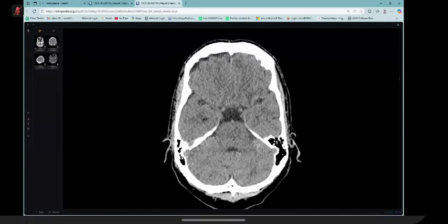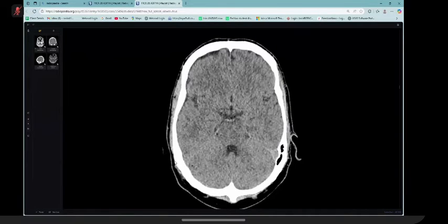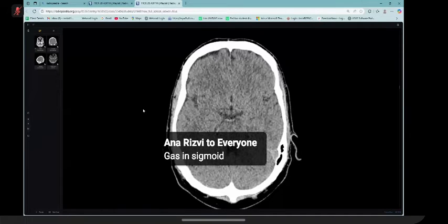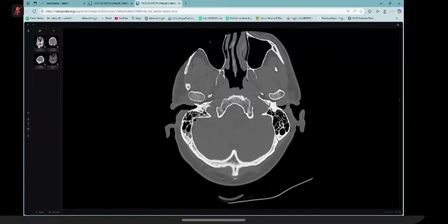It could be due to sinus thrombosis post-trauma. There's a small air focus as well, here in this region. That was the pickup finding. Okay, now you got it. I'm stopping it because the time is less. See, this was the pickup finding. If you go here, this was the pickup finding.